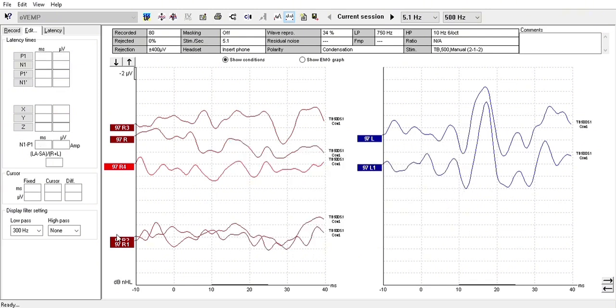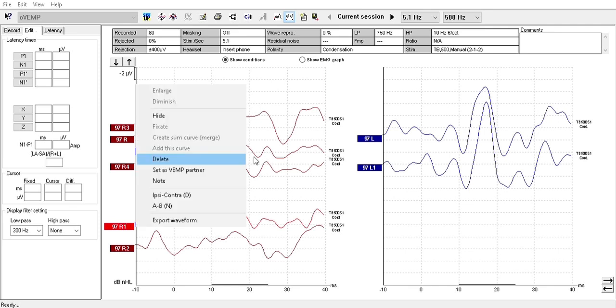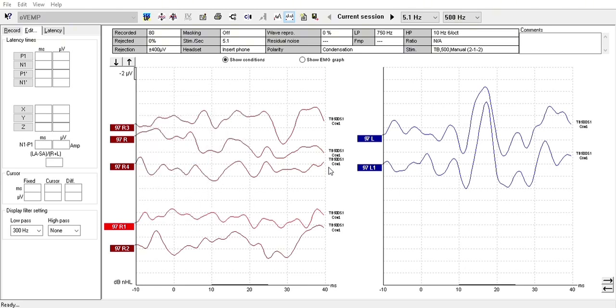Yes. These down here I don't love, these are not very pretty, and so if I want to delete these, I'm going to double click on the handle that I want to delete. If I click the waveform, it gives me waveform options like placing things. But if I right click on the handle, it will let me delete the entire curve, the waveform. Note that if you delete this, it is gone forever. So when I delete it, that's not coming back.